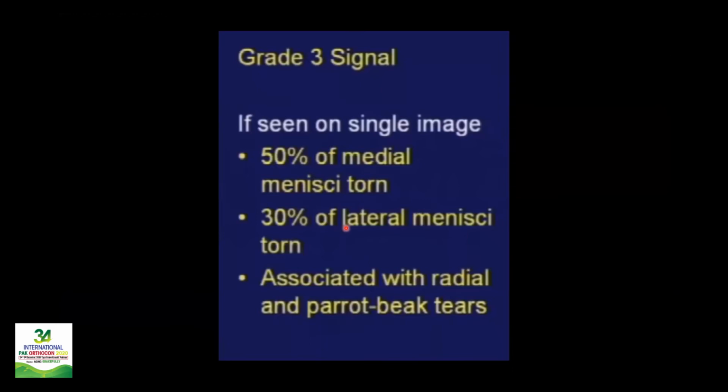So in these cases, normally what you can do is ask them to follow up after a certain time, like 3 months, and see if the signal has gone away or still stays there.